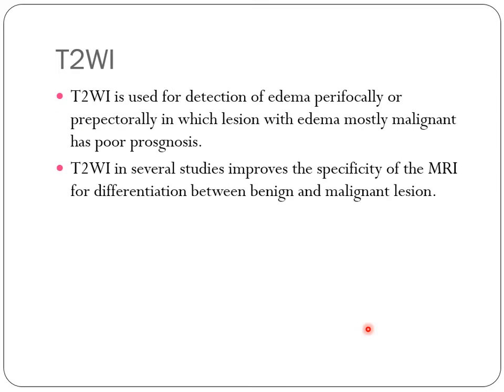So we are mainly looking for lesions that are hypointense on T2 fat saturated image. Yes, hypointense. And what's important here is that T2 weighted image will help in discrimination of the breast lesion, but you have to depend on the other acquisitions in order to figure out the final discrimination of the breast lesion.